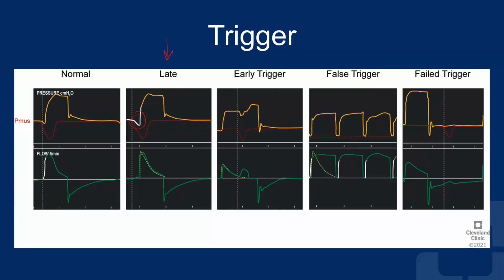All righty. Then you have this waveform, and this waveform is a series of breaths in rapid succession. You have the pressure, you have the flow and volume. And as you look at it, they are fairly consistent. This is again volume control, so every breath is controlled, and there's again an inspiratory pause, this period over here, in which there is no flow. In all the breaths, the pressure looks about the same. And the decays, every single one of them looks very similar, which tells me that I don't see any evidence of patient muscle activity.